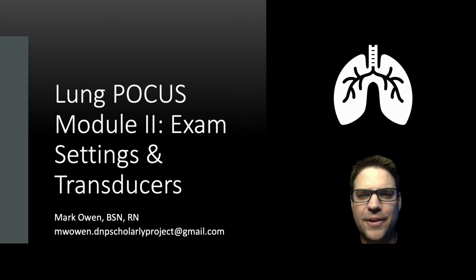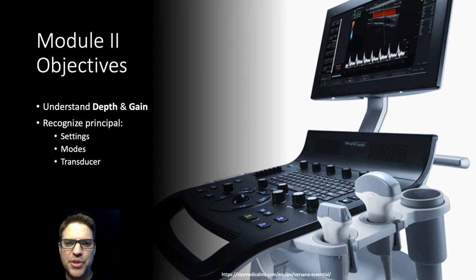Welcome to Lung Point of Care Ultrasound Module 2, Exam Settings and Transducers. Module 2 objectives include understanding depth and gain, and recognizing the principal settings, modes, and transducers used in a lung point of care ultrasound exam.